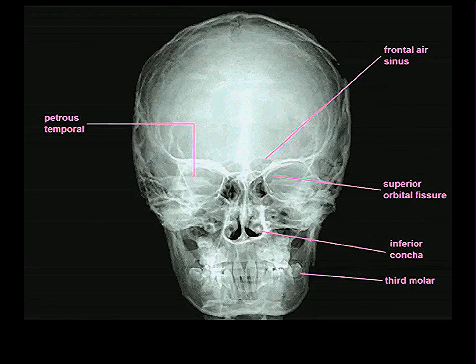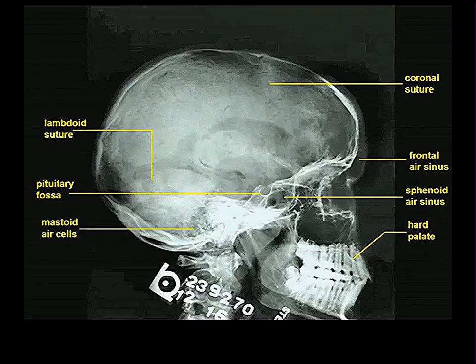None of these other things do I have to spend any time on, other than to say that it looks to me like that third molar is probably still unerupted. It's probably still in the mandible. Of this lateral view of the skull, by far the most important thing is this pituitary fossa, the bone surrounding it. It's called the sella turcica. Sometimes clinicians just refer to the fossa as the sella turcica. And again, nothing particularly interesting that you can't figure out on your own.